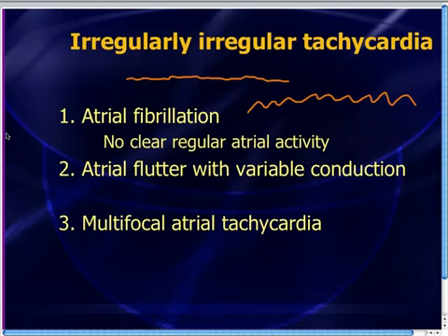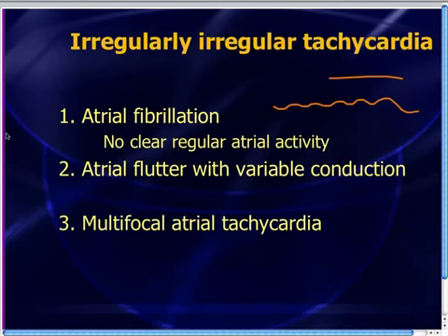And if somebody went into AFib for the very first time, that's probably what you see. And then the longer they stay in AFib, the more it starts evening out. All right, so you start out with coarse AFib, and oftentimes this bumpiness can be misdiagnosed as atrial flutter. But if you map out these bumps, they really don't map out regularly. And so, that's irregularly irregular, bumpy atrial activity, and that's referred to as atrial fibrillation.